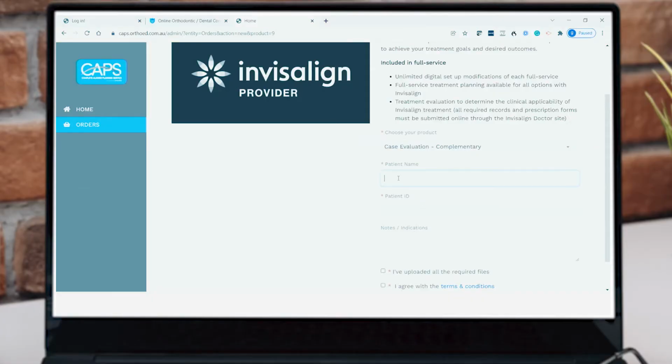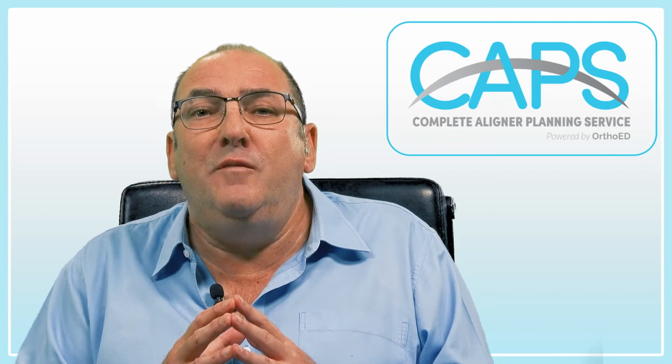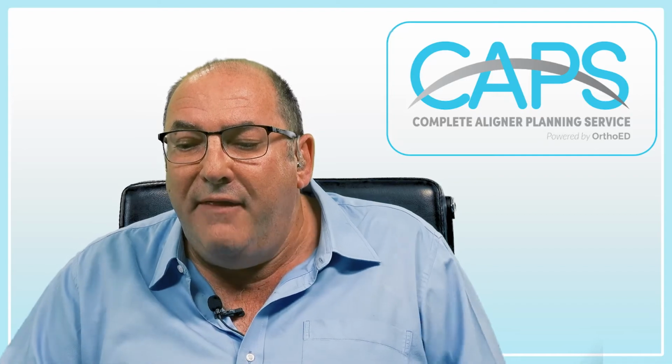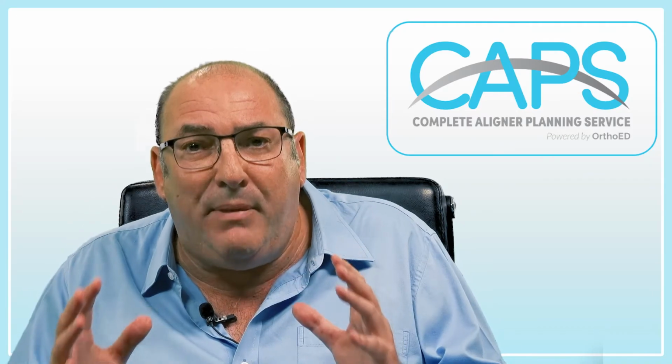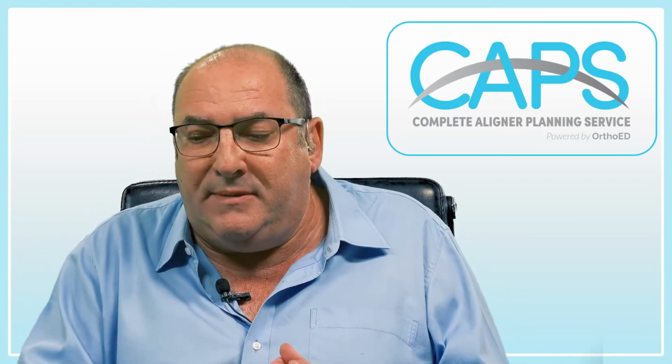All you would do is fill in the patient name, and we'll just call it test. There's an ID number, and you just type in the notes, etc. Now, what you have to realise with everything that you're going to do on the CAPS portal is that you must submit the case to your aligner provider first. In other words, there's a patient ID that is associated with this patient on Invisalign. So every patient must be submitted to your aligner provider first and then added to the CAPS portal.